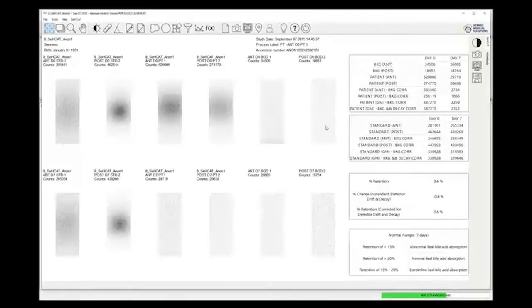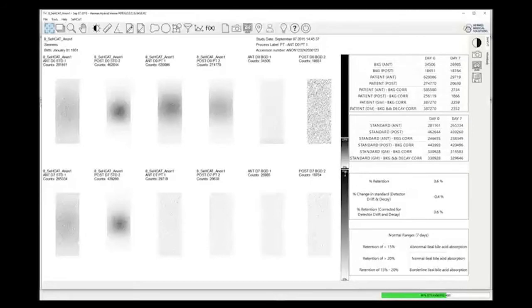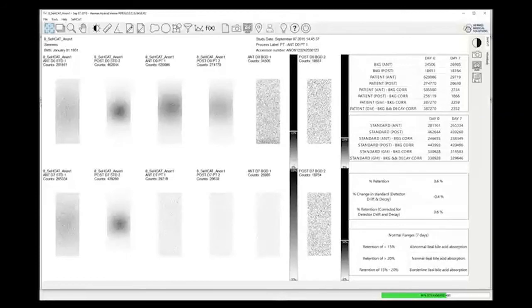So if you just hit the B key over one of those images, Lynn, yes, there we go, okay. You can get the color bar up. So yeah, I think when I put this in BARTS, I will make sure that the color bar is showing by default on the backgrounds to encourage the windowing to happen.